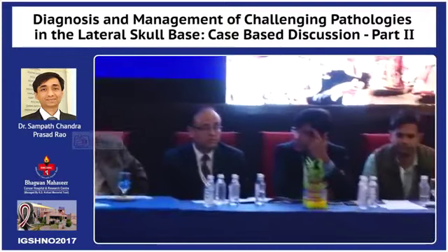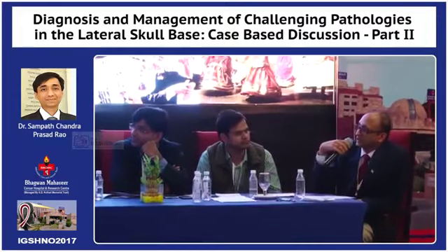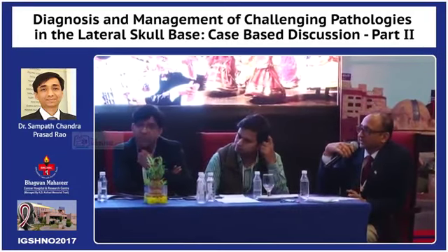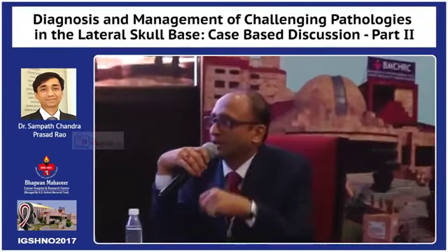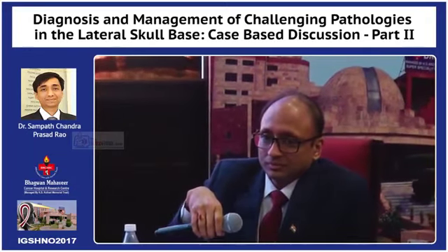Yes, I was coming to that. Good. So you think that it could be a D? It could have a D class. It could be De1, D extradural. You want to have a look again at the MRI? It's not going inside, but at least it's touching it. Let's see the MRI again. So that was one of my questions.